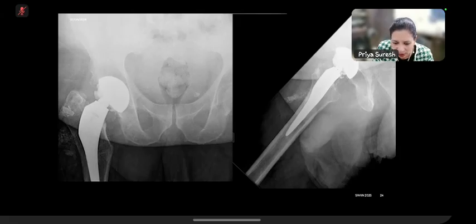That means, remember, we had seen whether it was a ceramic head. Now ceramic head, it's like china, isn't it? Like you throw it and it breaks into pieces. Okay, and that's what has happened here. So I think when this was reported initially, it was reported as maybe artifact on the patient, which happens sometimes because they come with different clothing and things like that. But this is quite dense and this is multiple, around it.